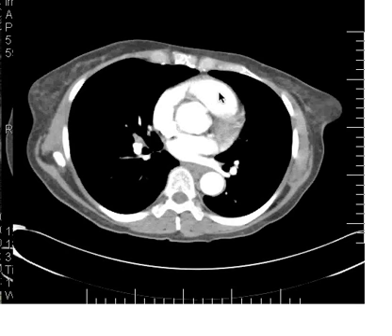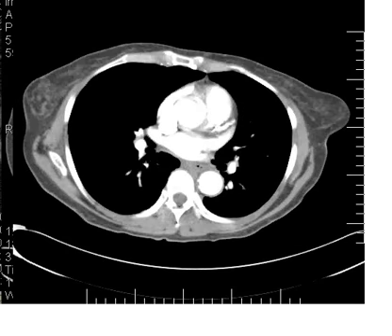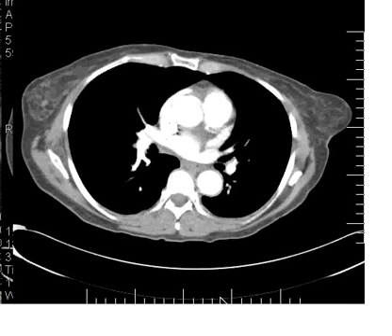And this is the pulmonary outflow tract. A lot of times you can actually see the valves in there too. But here we are. So here is the main pulmonary artery then. Here's ascending and descending aorta.